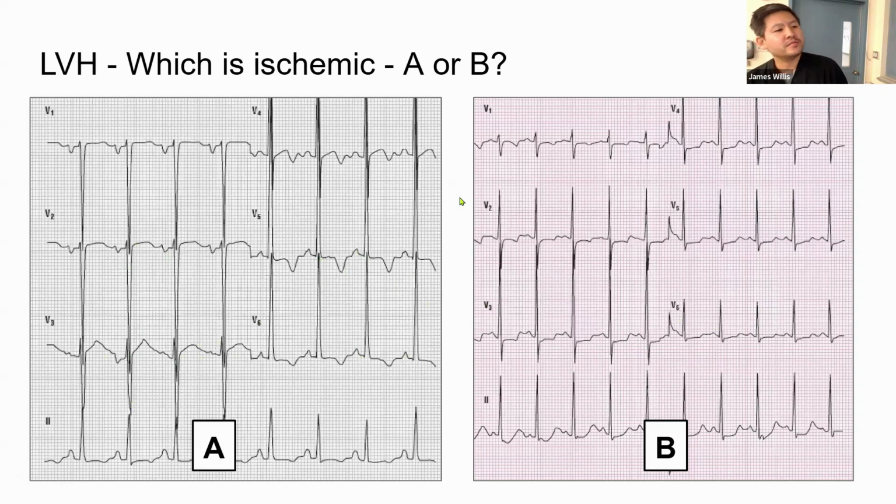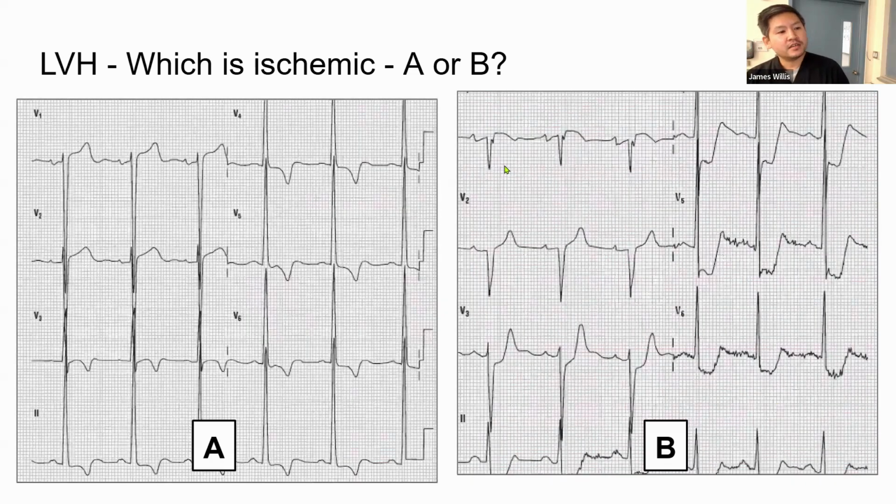And B. It is, this is hard to tell. Yeah, would this get me out of my seat? If I didn't have any of this, would this get me out of my seat? Probably not. Maybe there is some depression, but it's not enough to make a huge decision on. All right, what about this one?